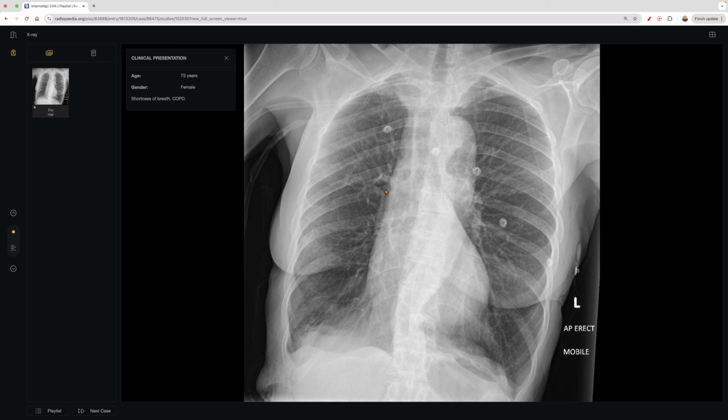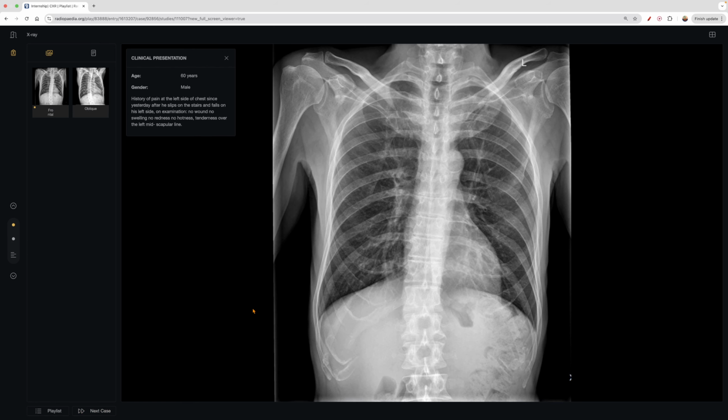This is important, a common thing to see in a hospital. And typically with those findings, you'd expect to see the diaphragms are flattened. In this case, it's a little ambiguous, but nonetheless, counting the ribs, you can clearly see that this patient has hyperinflated lungs. And then same thing with this patient.